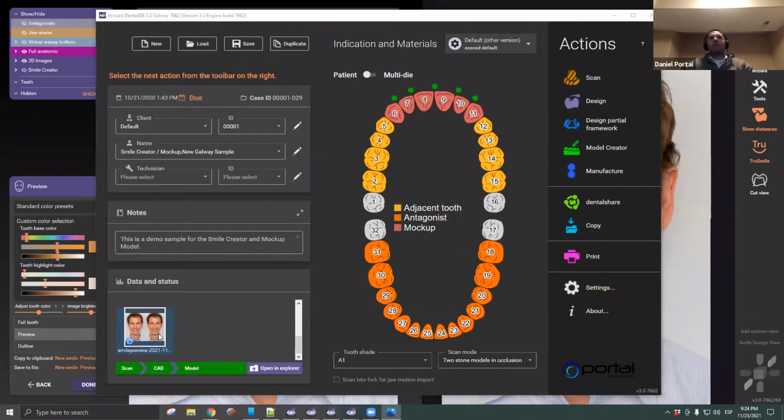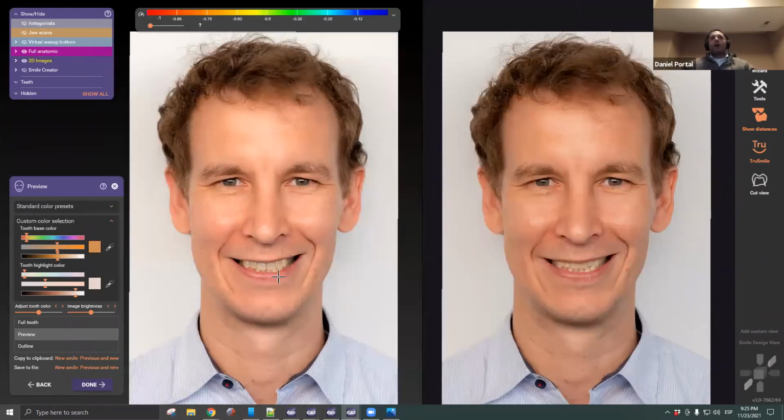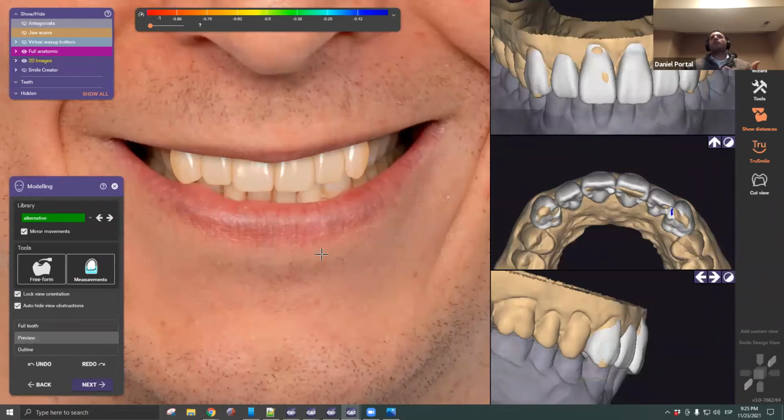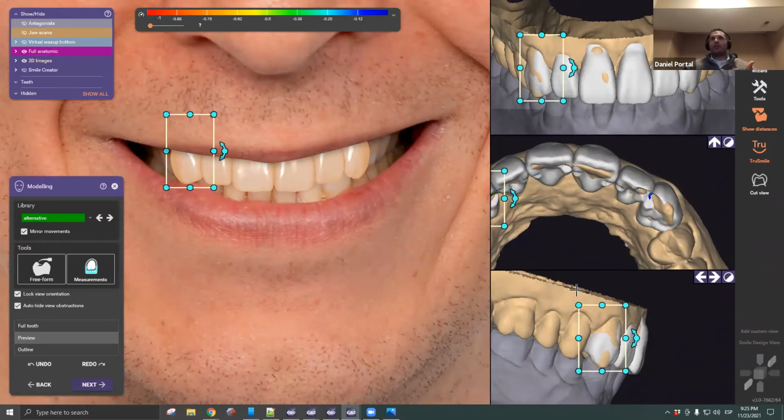And so then I'll be able to visualize it here as a picture that, once again, I can load into an email and send to the doctor. Now, once I have this, and I like the shade that was created, I can go back to the previous step and continue to do any further modifications, but with the anatomies being shown in the more correct shade.